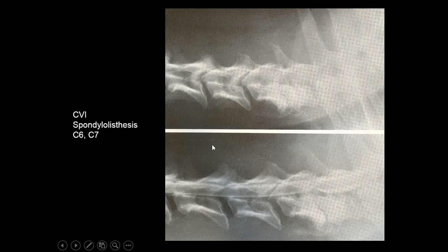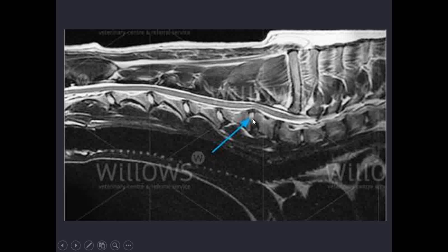You see this collapse. Look at this radiograph down here. Here's a myelogram. Good disc space here, and you see we got this lost disc space. This is almost like a herniated disc. You get the slipping of the vertebra, listhesis. You see the narrowing here. You see this tilting and compression of the cord.